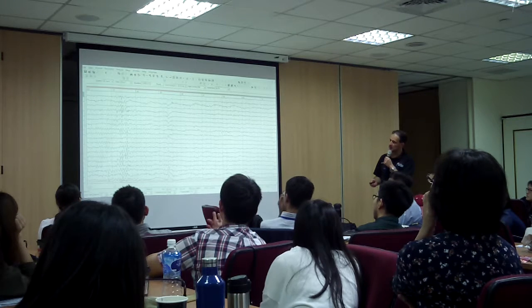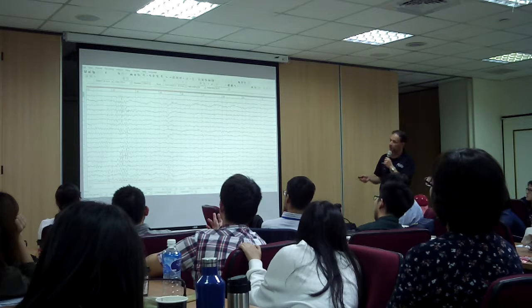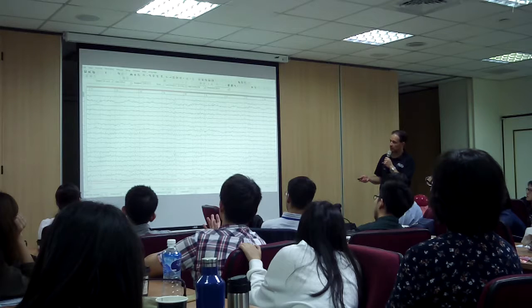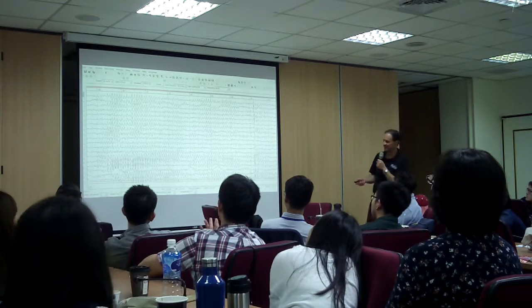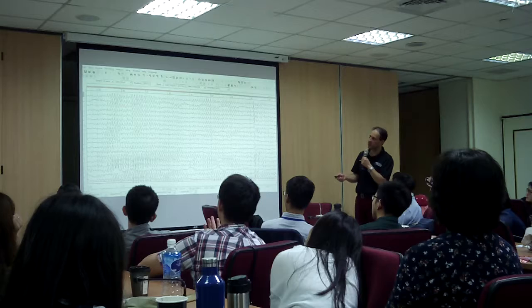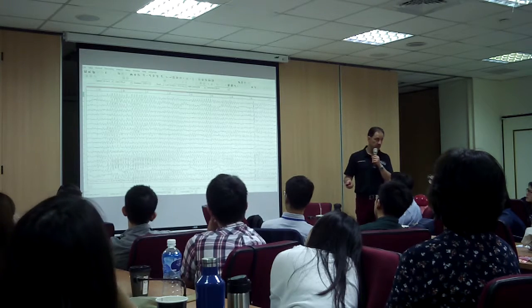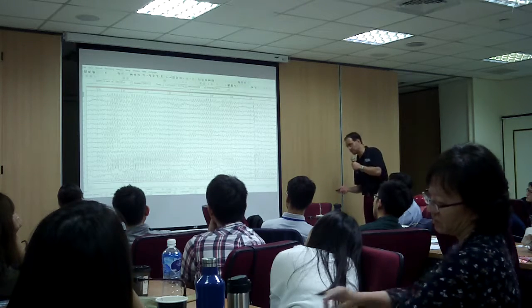Spike. This. And some slowing. Okay. I'm going to keep going and stop me whenever you feel like it. Yeah. See? Yes. Stop. Good. So see the slowing? So you get an idea. So do we have phase stability? So we have what? Hypercoherence. Very good. Very good.